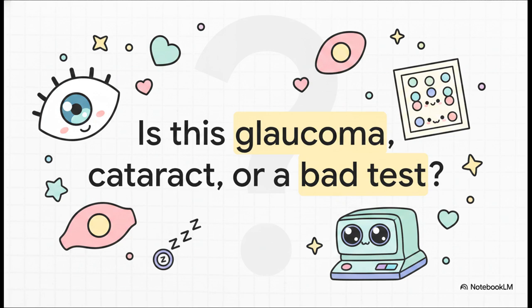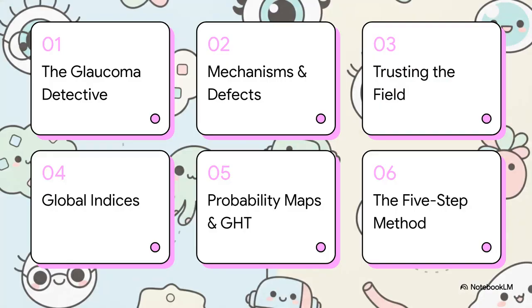Welcome to this explainer. I am so excited to guide you through this today because by the time we wrap up, you're going to know exactly how to break down a visual field printout step by step, just like an experienced clinician. So here's our roadmap for today.